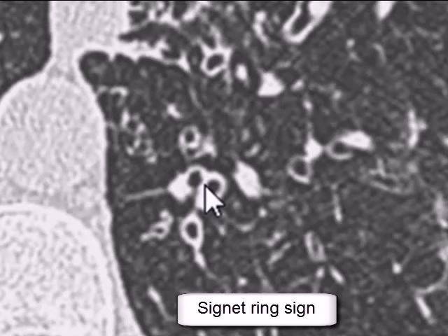Now the wall of the bronchus may be thick to indicate the inflammation of bronchus, but you have to measure the internal diameter of the bronchus and compare it to the pulmonary artery, which is in the same bronchovascular bundle, and it should be visibly and significantly larger. The bronchus should be significantly and visibly larger than the pulmonary artery.